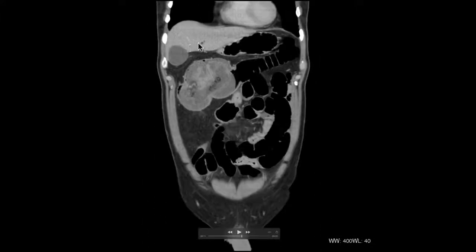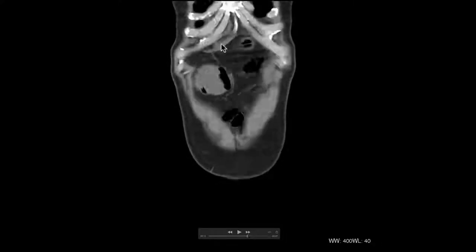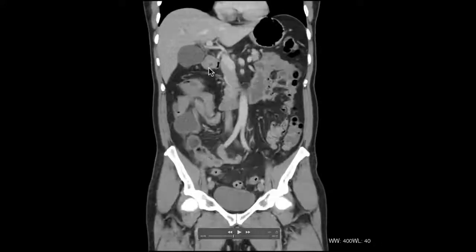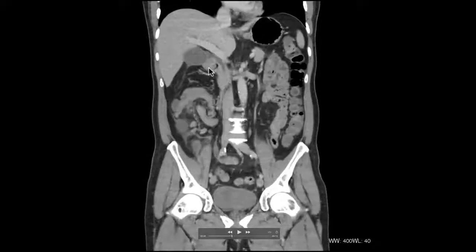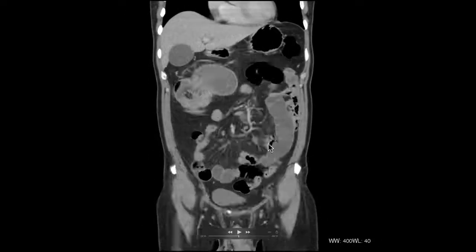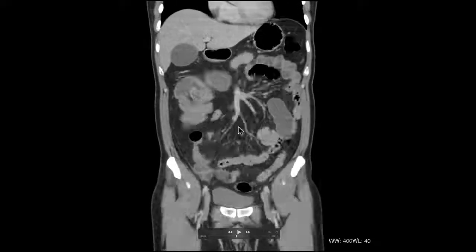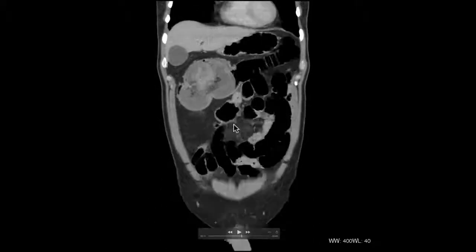quite something. And again, a quick look at the liver there, just to make sure there's no metastasis, especially in that left lobe, where it's a bit tricky to see. And the small bowel looks a little bit more blown up on there. Yeah, there are a few loops that look quite prominent, so maybe they are intermittently obstructing, which wouldn't be surprising really, given what that looks like.